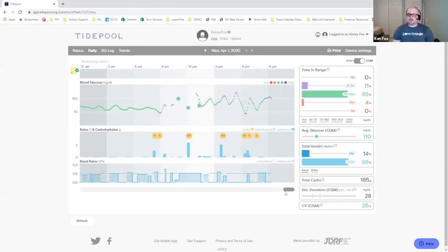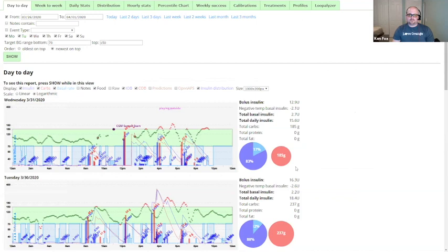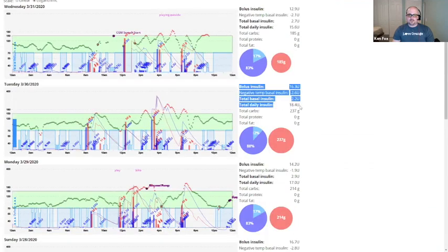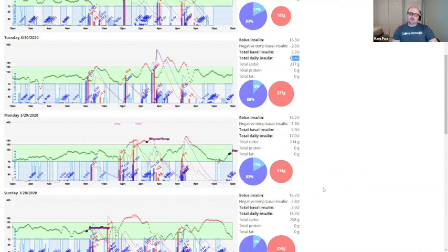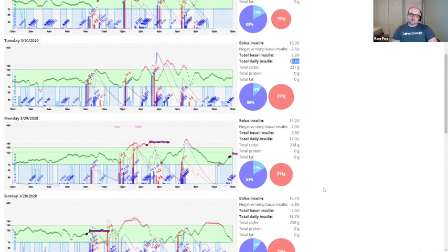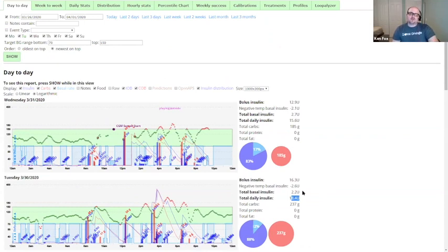So you'd see this says like 15 to 19 is kind of a normal day for Tessa. And on this report, again, the numbers might be similar, but they're gonna be way different because I'm using auto bolus, so they're a little closer to right. But when you're not using auto bolus, you're using the normal basal rate modulation in Loop, it can be really high. Like it was showing like 22 to 23 units per day, but she was only using about 18. So it can be off.